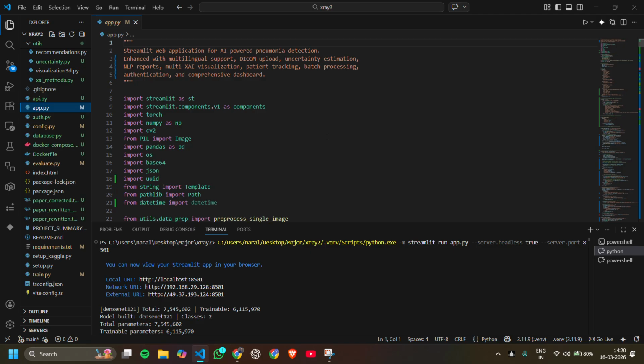and normalizing pixel values to improve model stability, and applying data augmentation techniques such as flipping, rotation, and color adjustments. Data augmentation is important because it helps the model learn different variants and prevents overfitting. Finally, the dataset is divided into training, validation, and test sets.